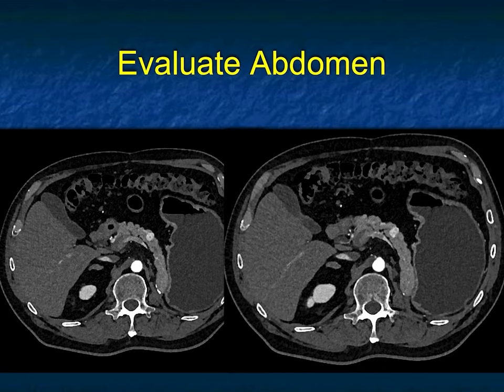This patient has abdominal pain, but this study, in fact, was really a follow-up study. This patient had a primary tumor. If you look hard, there's clips by the left renal bed. This patient had a prior nephrectomy, which explains why the tail of the pancreas falls posteriorly and the stomach falls posteriorly. There was then an enhancing lesion in the patient's pancreas.